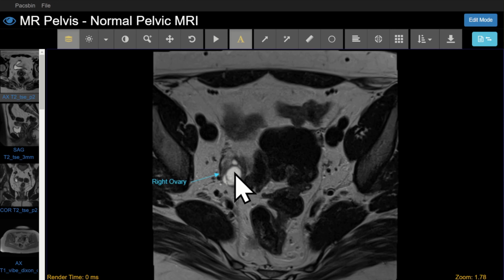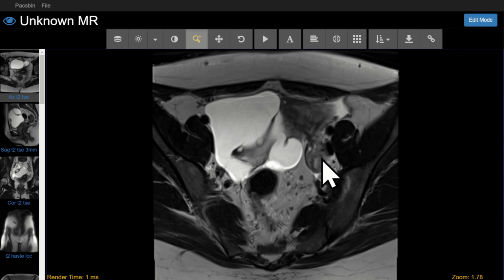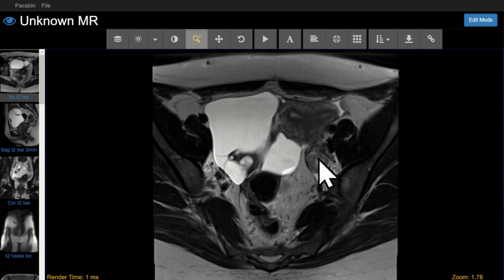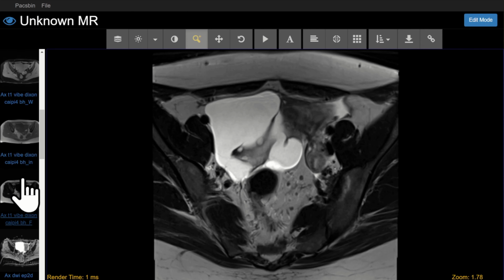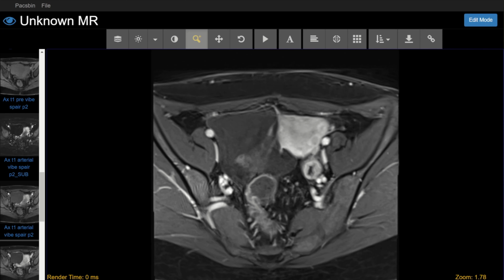Then ovulation occurs and you get a corpus luteum cyst that involutes, and it can look like this with somewhat irregular, thick walls that often enhance very avidly, like this. So this is a corpus luteum cyst, again, normal. You can also get some hemorrhage within a corpus luteum, a so-called hemorrhagic cyst, also physiologic. These are temporary and should disappear at the next cycle.